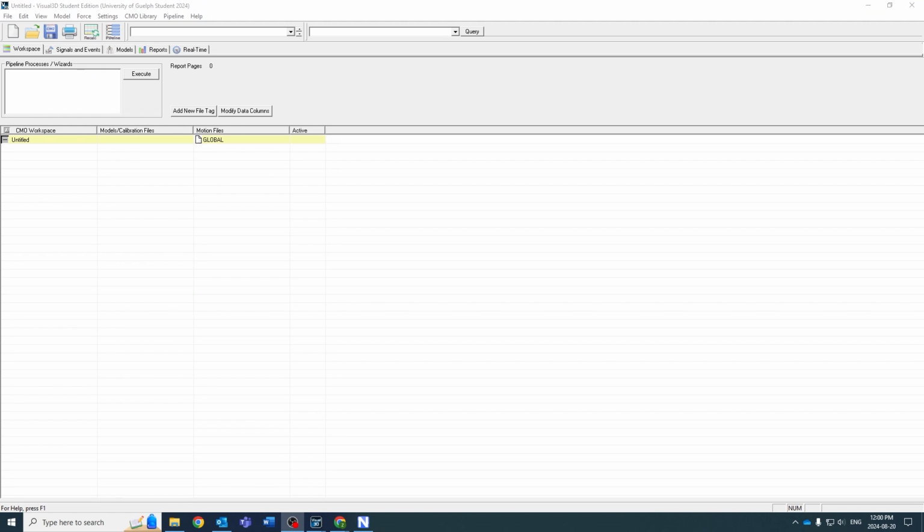Hi, I am Ziad, and this is going to be a casual recording of data processing in Visual3D. This is part 2 of 2. Part 1 was processing your data in Vicon, and this includes labeling your subject, creating segments, gap filling, and exporting your data. So this is picking up where the first part left off. And here we are assuming that you have your data exported and ready, and it is in C3D formats.